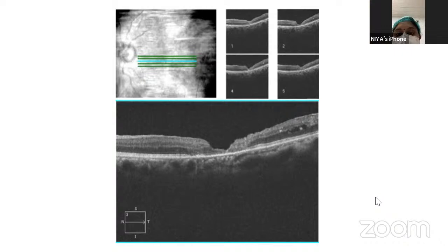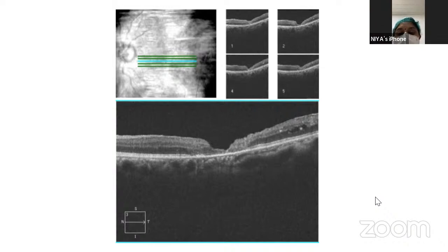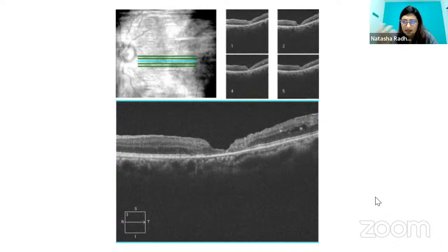We would not know the cause. So there are some telltale other signs of parafoveal telangiectasia, in which there are deep vessels and right angle vessels at deeper retinal levels, as well as some pigmentation. Pigment clumping as well as the migration of the RPE layers, which we can see on OCT. Okay. What is the clinical appearance?